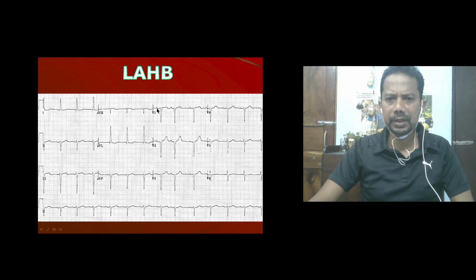It has overpowered the left atrial component out here. P is upright. Usually there will be a biphasic P wave in V1. So you should do a chest X-ray, do spirometry, maybe a CT chest, and do the echo, look at the pulmonary artery pressures, things like that. That is how you should be thinking.